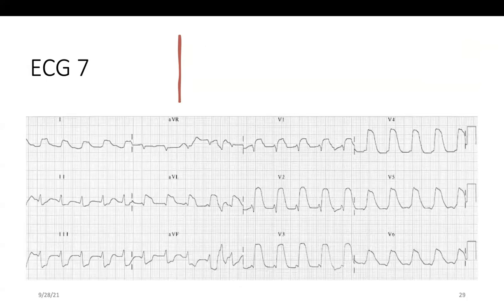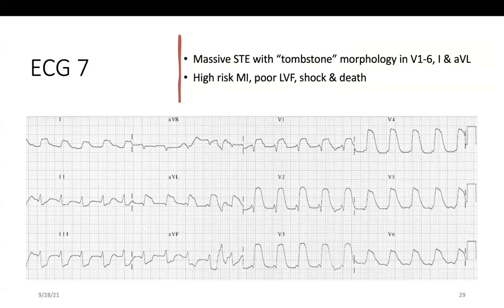What about this? What do we call this pattern of ECG? Tombstone. And this indicates an extensive MI. It's an extensive anterolateral myocardial infarction.